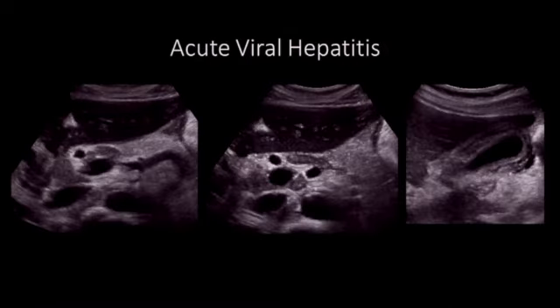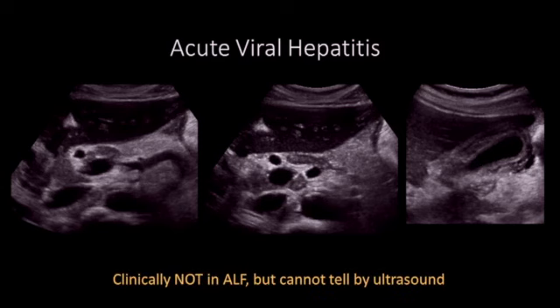Just a few other issues to consider before we finish. There are some patients who present with acute viral hepatitis. They have very abnormal liver functions and they are jaundiced, but typically do not develop encephalopathy. As far as imaging goes, they overlap with the patients with the hyperacute fulminant liver failure, so they may have a slightly hypoechoic liver, as you can see here. These are some lymph nodes, and often the gallbladder is small and edematous. It's the clinical findings that allow us to separate these patients from those with true acute fulminant liver failure.